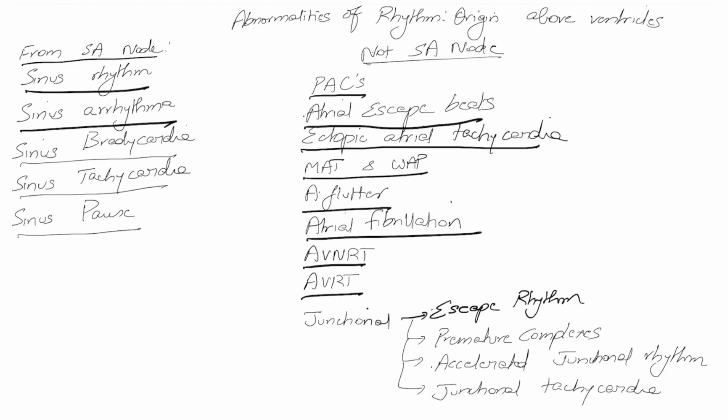In people with AVRT, look for an old EKG that shows Wolff-Parkinson-White syndrome or WPW syndrome. Now, if the conduction from the atria to the ventricles is happening from the AV node, the AVRT would be narrow. And if the conduction is happening through the aberrant pathway, then because it's not as efficient, you would see a wide complex tachycardia.